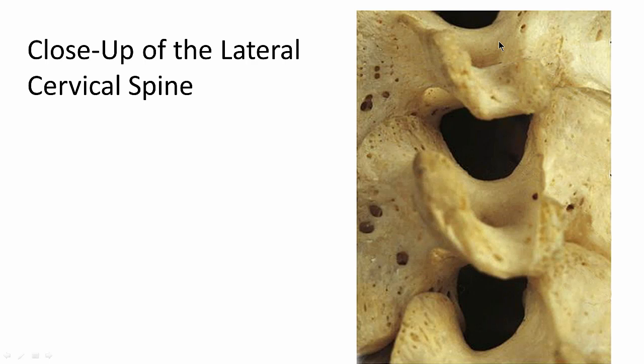The spinal nerve splits and the anterior ramus continues out here, or the ventral ramus. The posterior ramus jumps out of this neural groove pretty quickly. Now the lateral part of the vertebral body in the cervical spine has a raised-up lip-like section, and that's actually called the uncinate process. It articulates in what many believe is a true diarthrodial joint, although there's still some contrary opinion about whether or not it's a true diarthrodial joint. But it does have a capsule, and some research says there's some synovial fluid in here.